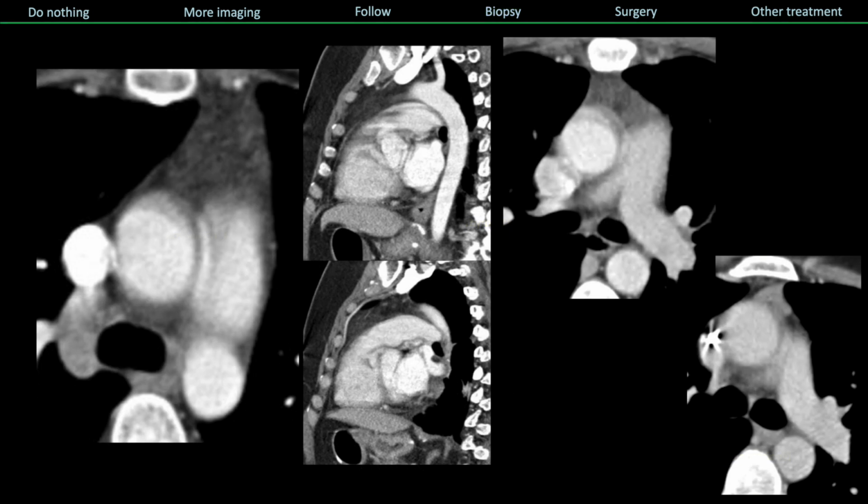But the anterior mediastinum is more than just tumors. A lot of the things we do on imaging actually are to try to prove that something isn't a tumor. You should be comfortable with what a normal or hyperplastic thymus looks like, particularly on CT. I often say it can look like the pancreas, so it can have some soft tissue and stippled macroscopic fat when there's that residual thymic tissue. It may connect to the thymic vein, which drains into the brachiocephalic vein, a structure that I use to identify thymic tissue.